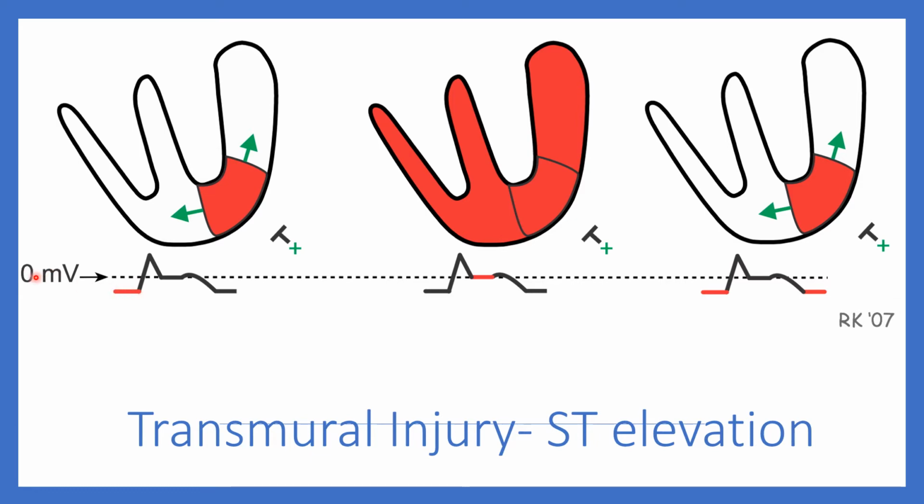So here is the baseline voltage, and your resting voltage of the EKG is always below that, and therefore your PR segment is depressed. During ventricular depolarization, the entire myocardium gets depolarized, so therefore you get a QRS complex, and then you reach the zero voltage after the QRS complex, which keeps the ST segment above.